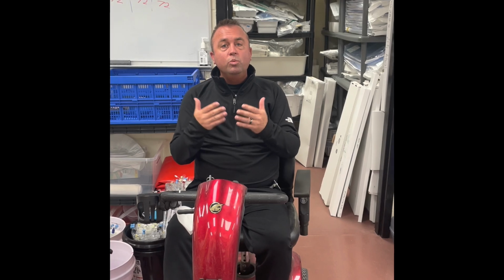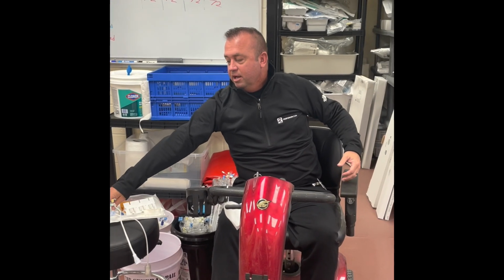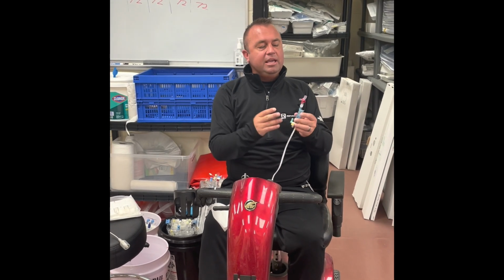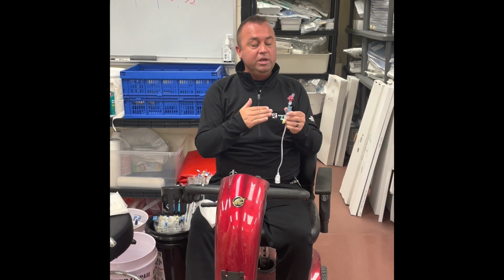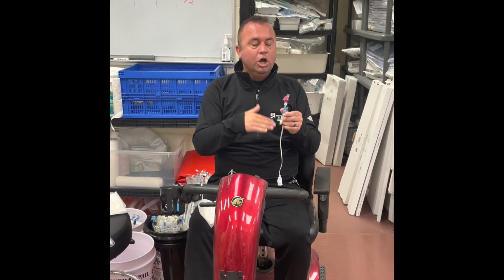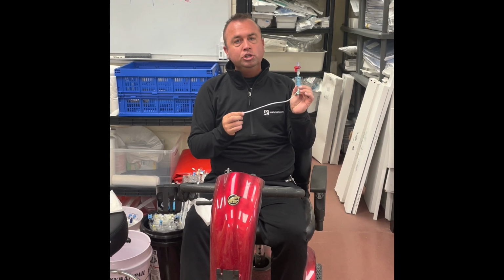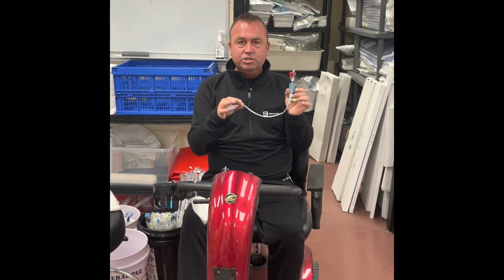Okay, so we also have to understand and know the difference between zeroing and calibrating these pressure transducers. Calibrating a pressure transducer is essentially setting a device to a normal or a constant, so that we know the numbers we're reading are actually correct. Whereas zeroing is creating an absolute zero according to atmospheric pressure.